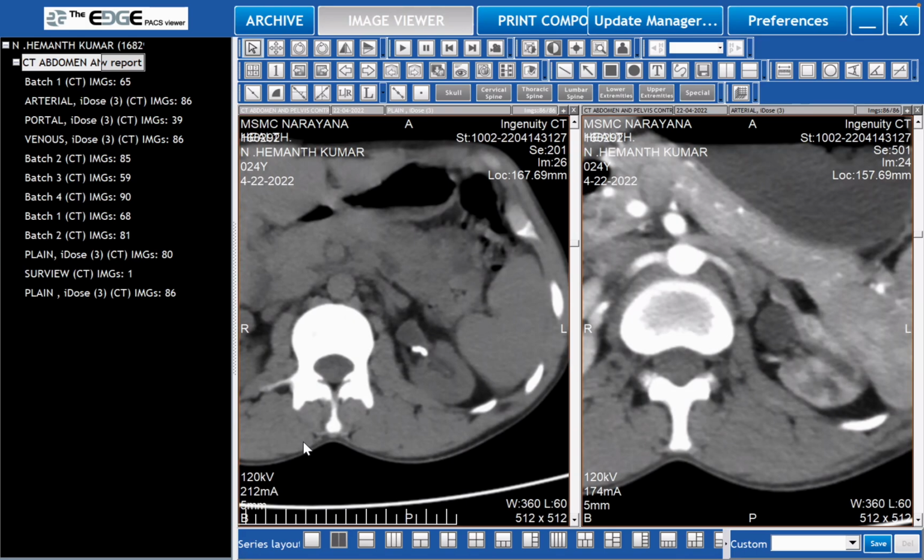Now it appears as though there is another hypodense lesion sitting in the hilar area. There is a pelvis, the extrarenal pelvis. See all the films. There are numerous things in this section CT that warrants discussion. It's a very interesting CT scan.